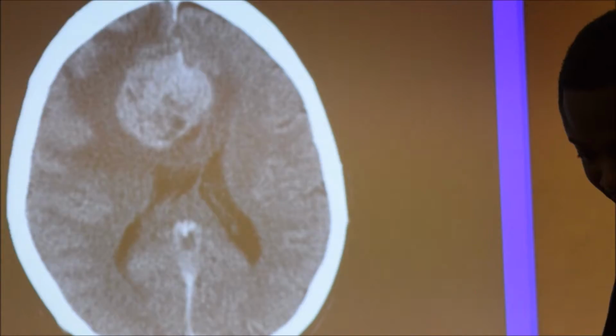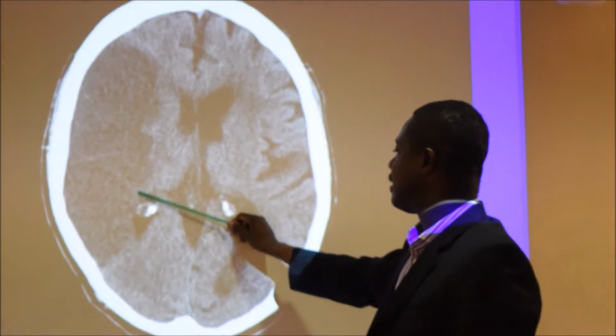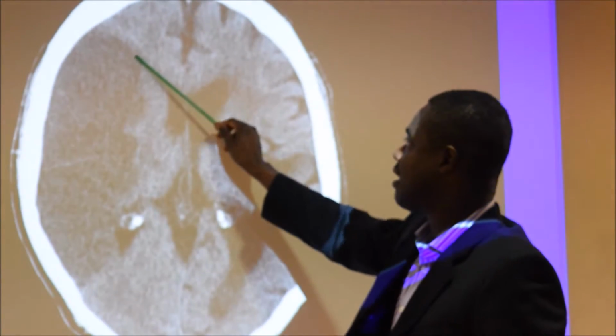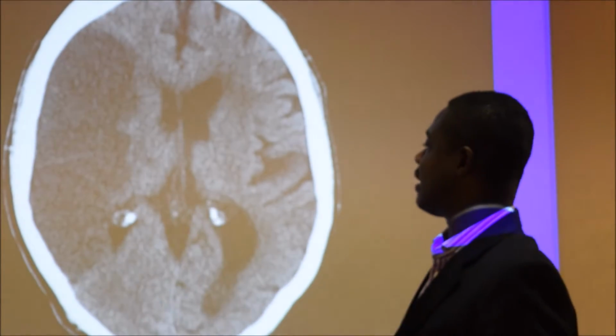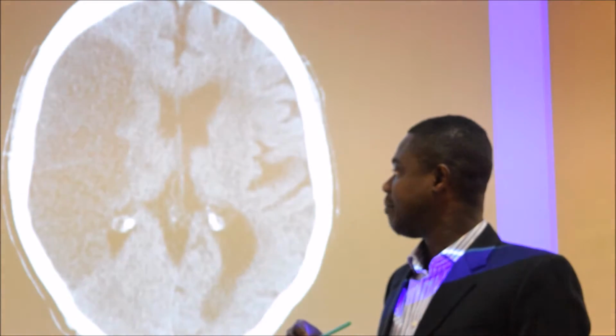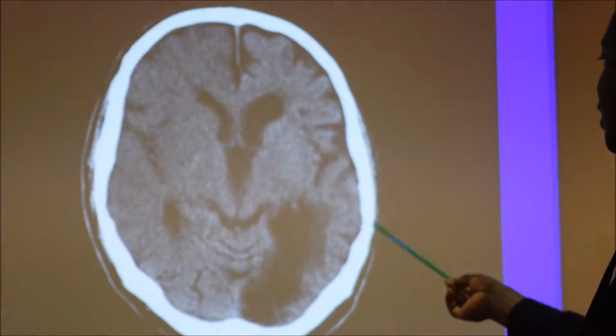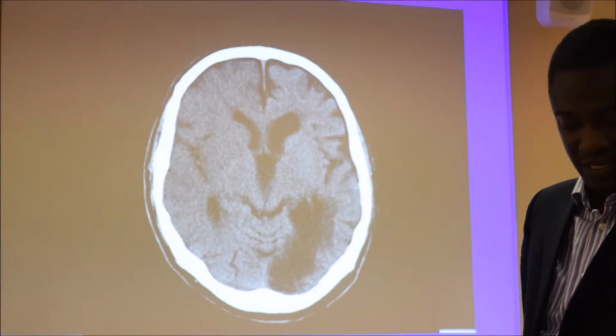This is a meningioma. And it's not only high densities that we look for, we also look for low densities in CT. This patient has a very sharply marginated area of low density here. It's not a tumor because it's not pushing anything. And it conforms to a vascular territory within the brain. And a patient with an intracranial infarct presenting as a stroke would have this appearance. And sometimes a stroke may be old. And this one, for instance, is the region of the posterior cerebral artery.